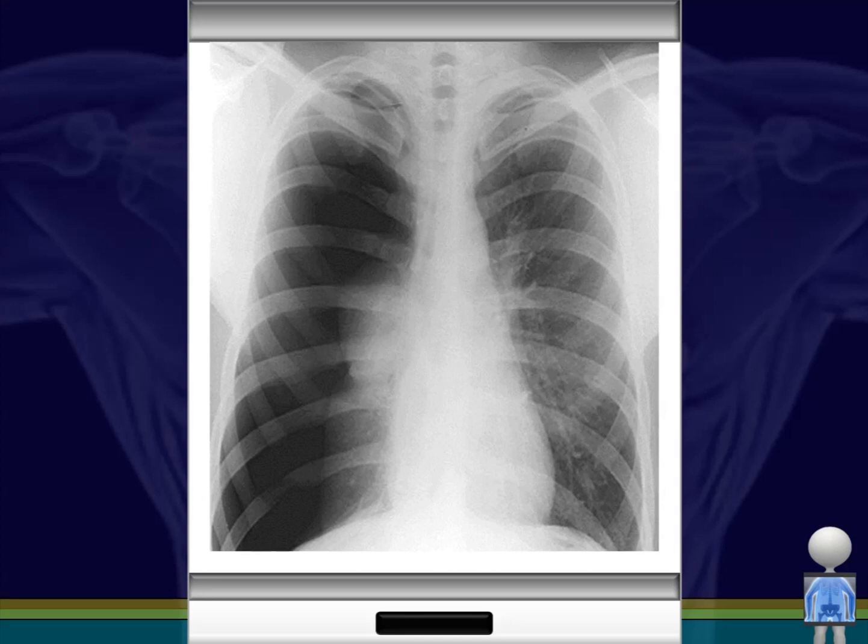In this case, we have a pneumothorax. How do we know we have a pneumothorax? Well, when we looked at our normal lung film, one of the things we needed was to see something, correct? So clear lung fields are not empty lung fields on a chest x-ray. The same way, when you listen to somebody's lungs, clear lung sounds are not absent lung sounds. The adventitious sounds that you hear as somebody takes a breath, and you can hear the air going in and the air going out, are extremely important clinically to differentiate from "I don't hear anything." And much like that on a chest x-ray, it's extremely important to be able to tell the difference between there is no lung there and it's air, and there's normal lung tissue.